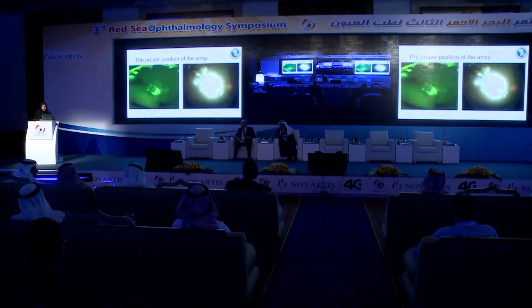This is the right location; this is the first day post-op for my patient. The right location, center in the macula, center fovea here. The edge of the array should be at the temporal edge of the optic nerve. This is a very important location to succeed.